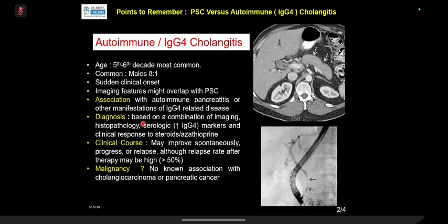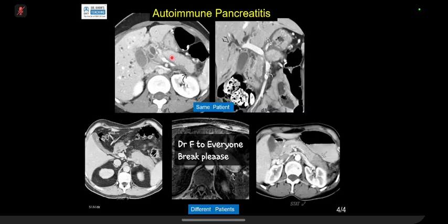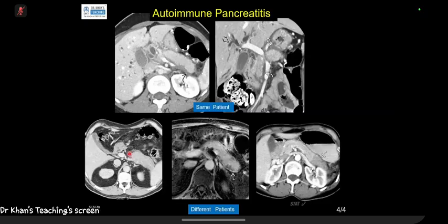Look at this pancreas. This is an exam case. There is loss of what we call pancreatic lobulations. It looks very smooth, and sometimes you will see a bit of rim around it. You see this thing? Sausage shape, comma shape. What comes to your mind? Autoimmune pancreatitis. So in your exam, they can show you autoimmune pancreatitis with the cholangiopathy, where there is enhancement also. Okay, thank you.